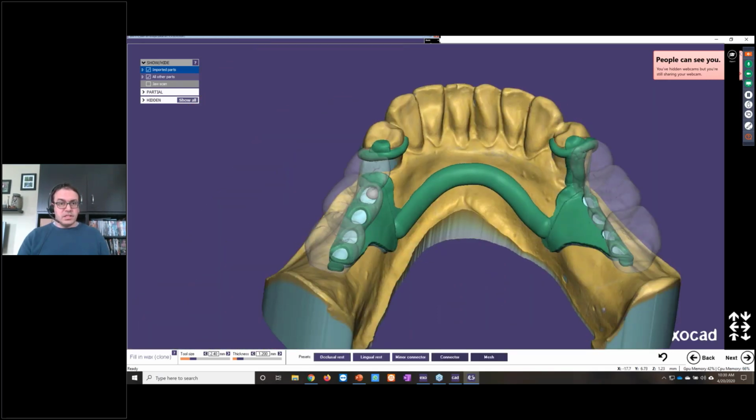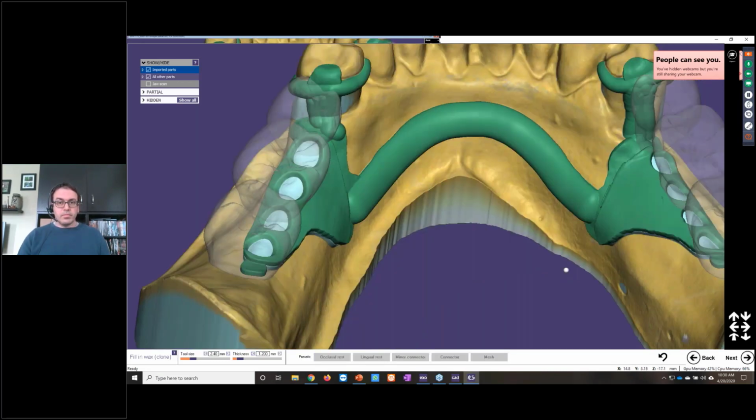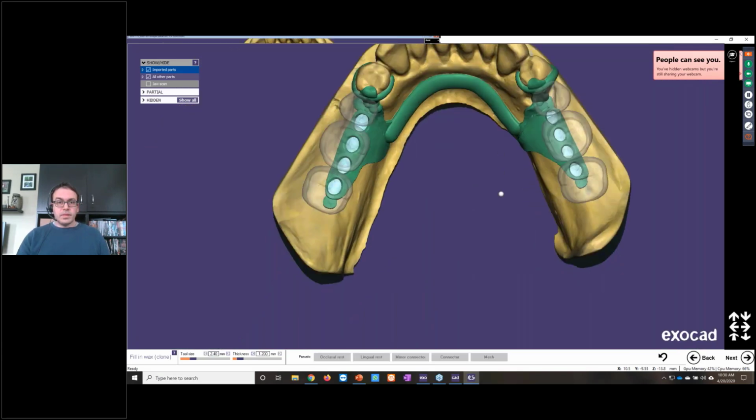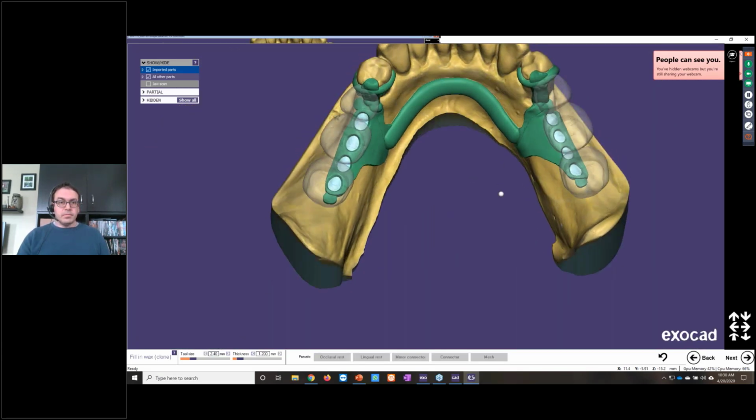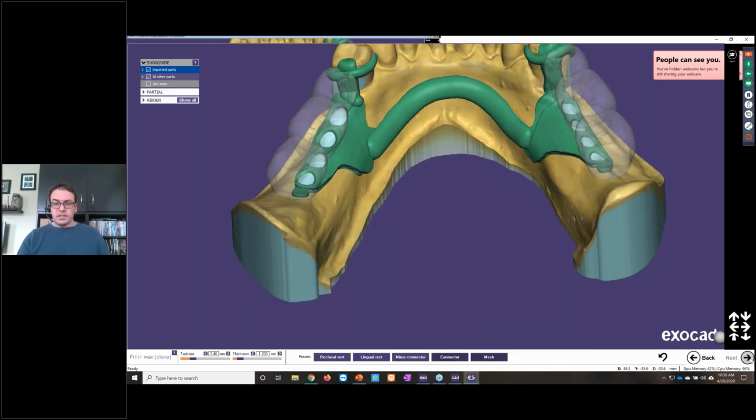And then same thing on the other side. Okay. Let's click next.